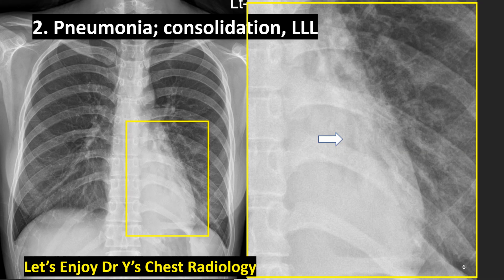Second example of left lobar alveolar pneumonia. With the first image, we don't see the retrocardiac structures of pulmonary vessels, aorta, and diaphragm. That means there is a dense consolidation behind the heart, because the heart is in a frontal location. In a closer, magnified view, we see some airways showing air bronchograms and dense consolidation of exudate, representing lobar pneumonia of the left lower lobe.